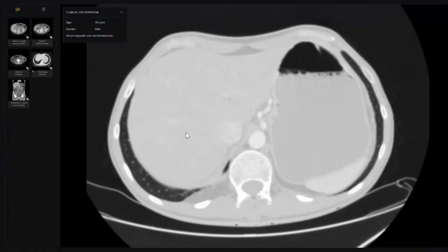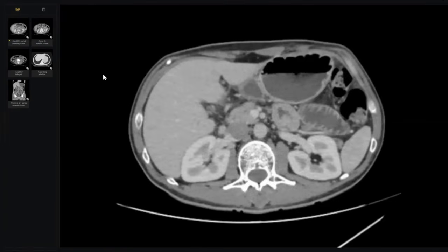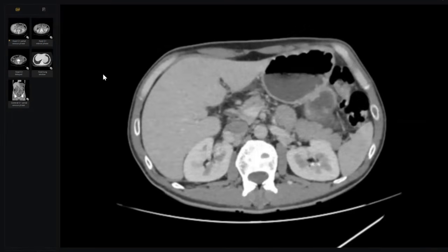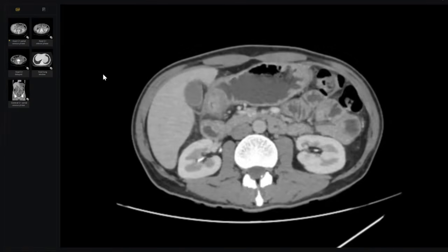I would like to go again to the soft tissue window, looking for the area of rupture. Which phase do you want, arterial or venous? Venous. Okay, this is the venous study. The stomach appears distended with contrast, no air lucency around.